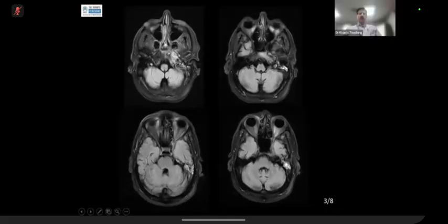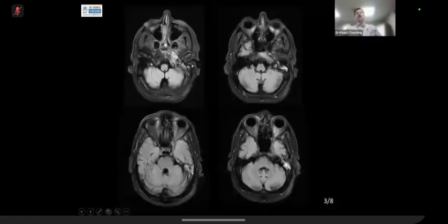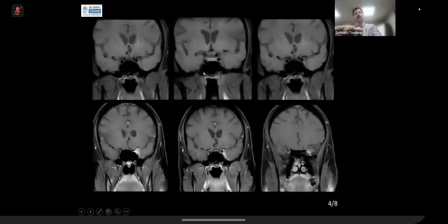So which portion is this? It would be the petrous portion. Yes, and this is the clivus. This is unusual because we had done a brain type of protocol, so there was a FLAIR. But the point I'm making is that even on a FLAIR, because it is fat saturated, you can see something happening there. Unusual to see that. You can compare it from here.